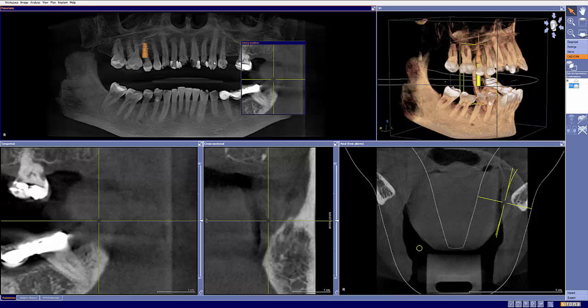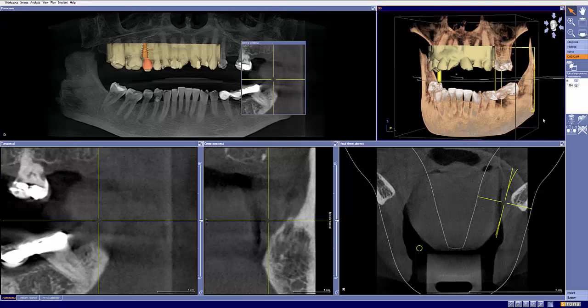As we can see here, we have plenty of natural teeth. To have an OptiGuide, we need at least one tooth posterior and ideally all the way over to the cross arch. Here we can see that we do have just enough CEREC data to allow us to fabricate a well-fitting OptiGuide. One comment on this one would be, next time, go ahead and capture it right here, so that you can capture to the premolar, maybe even a bit of the molar, so that you can use a bite block to hold the data in place.